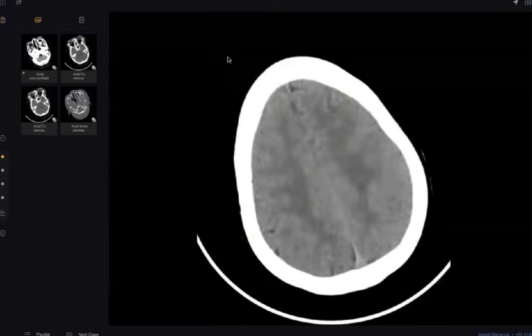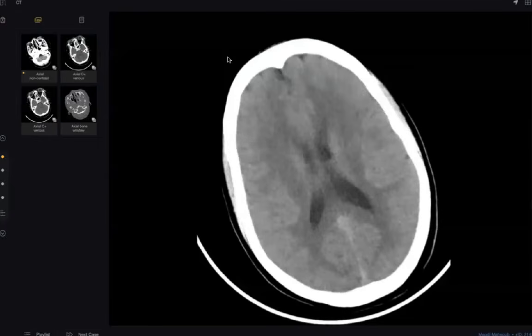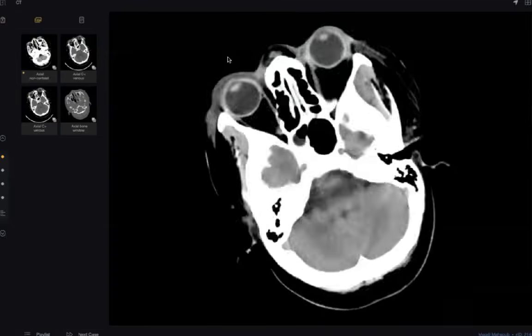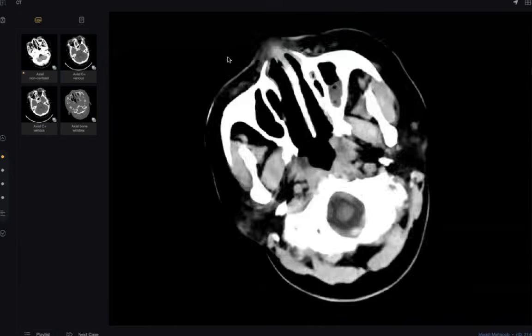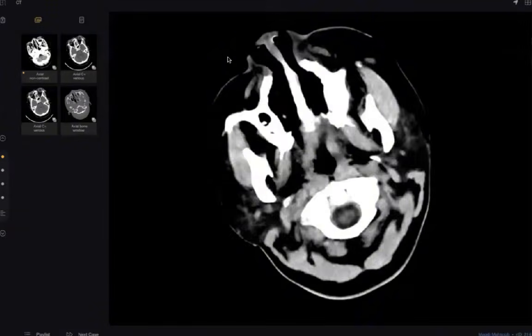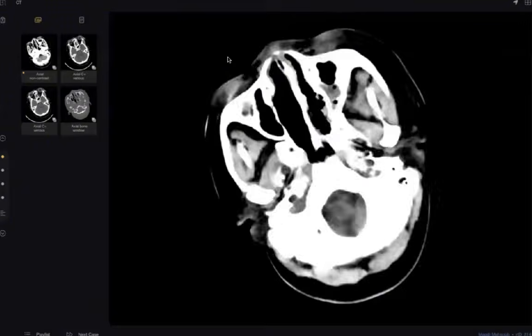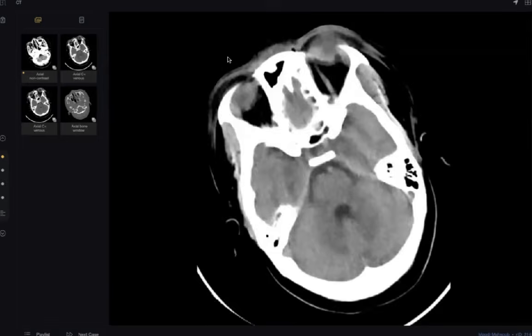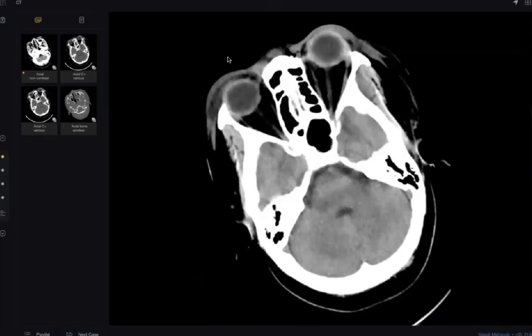Okay, so I'm presented with a CT scan of the brain, axial cuts, for a 55-year-old female with left eye symptoms. I would like to have a general look before starting my comments. I would like to concentrate on the region of the globes, given the history and the complaint. The left globe shows mild increased preseptal soft tissue thickening.